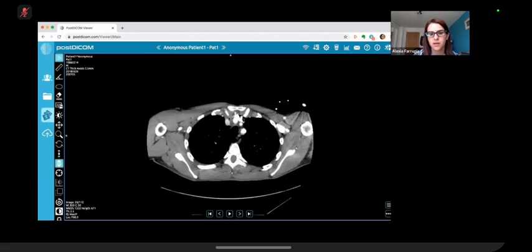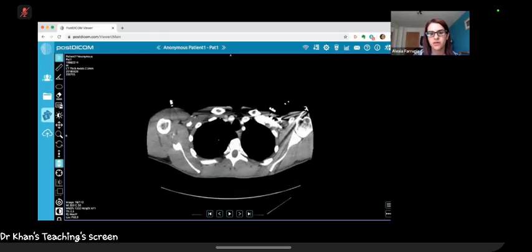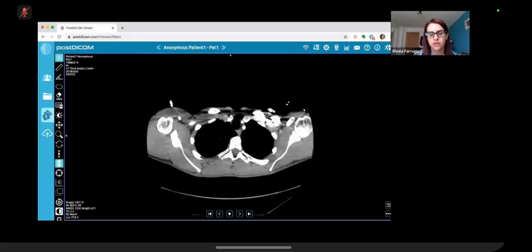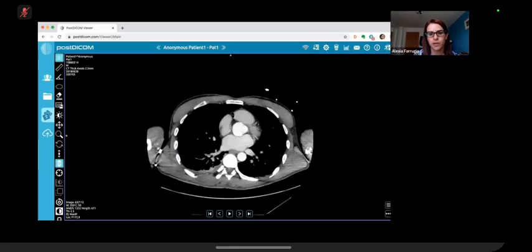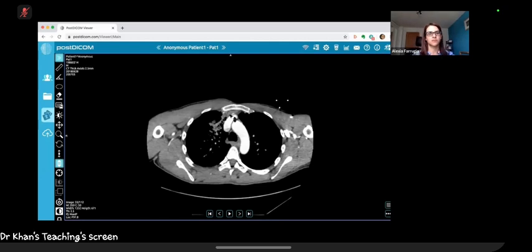It's a severe injury, but fortunately, the right internal mammary, the subclavian, and the great vessels of the thorax were not injured. But it's in that area, very, very close to the internal mammary artery on the right side. As you said, there's a small right hydropneumothorax, but there was no active contrast extravasation.